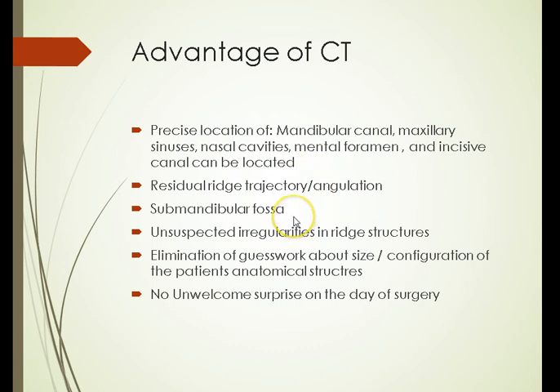Submandibular fossa, when we're going to talk about the anatomy portion, I'm going to take the CT scan and anatomy and kind of show you why that's more important, but at least right now, just a starting point, it helps figure out the depth of the submandibular fossa. Any surprises within the ridge? We see that all the time.